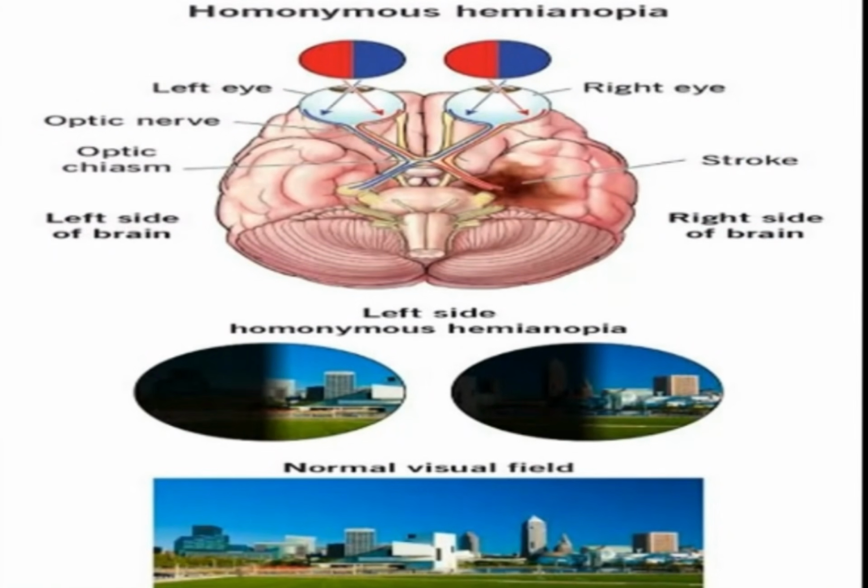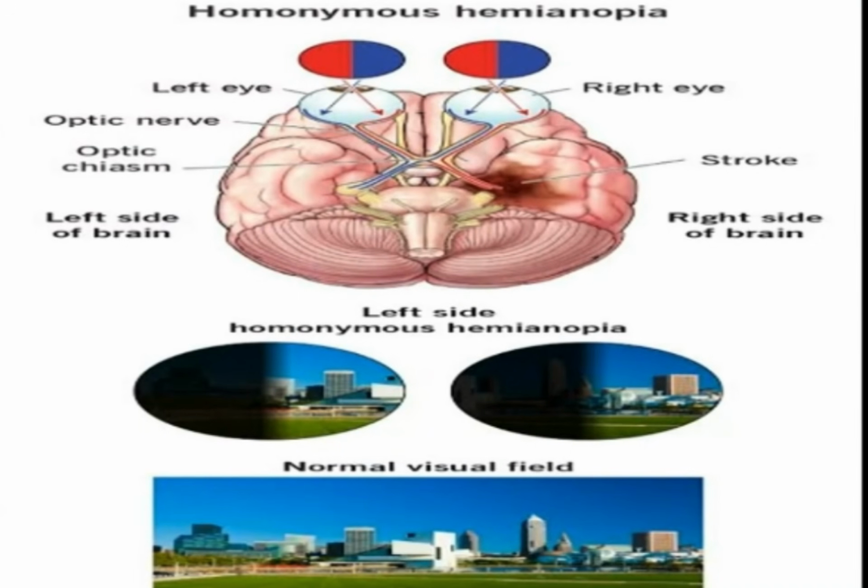This is what a scotoma looks like. You can see the area of unseen, the blurred part, surrounded by the island of seeing, that is the clear part. This is what a hemianopsia looks like, loss of half of the visual field. If you look at this image very well, you will see that half of the vision here is lost for this eye.